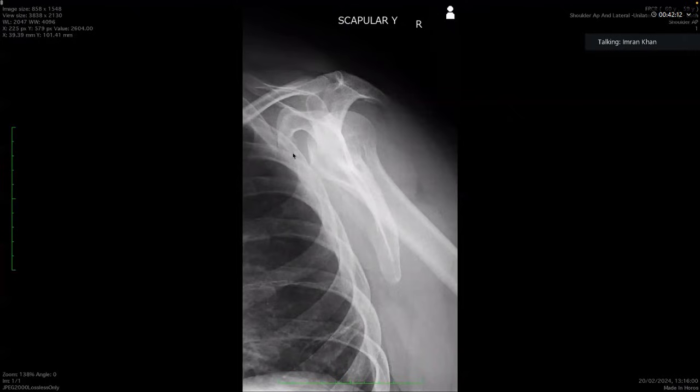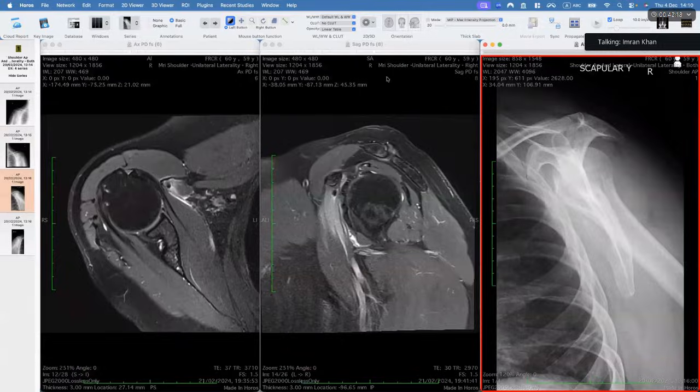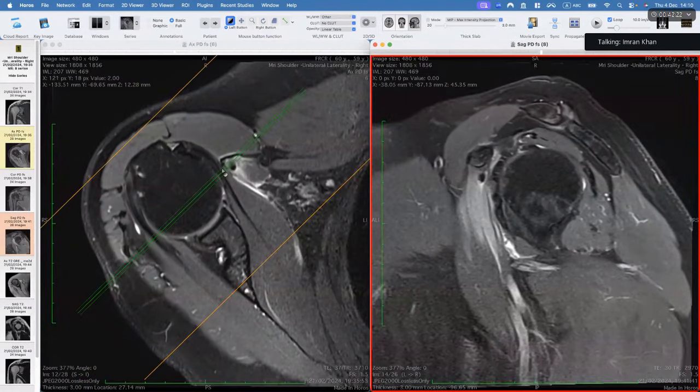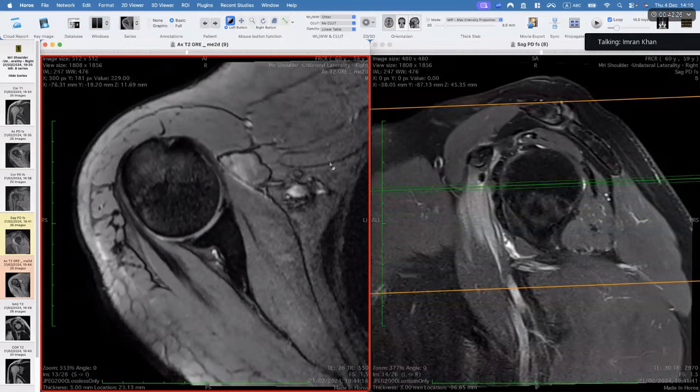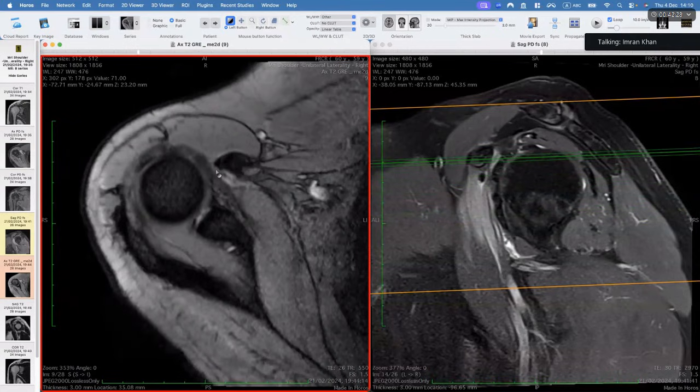The question I would ask if I was an examiner: I can't see the calcification, so how do I confirm it is a calcification? Well, you can look at gradient echo images, which do show calcification. Or you can do an axillary view of the shoulder, and sometimes you may be able to pick up the calcification near the coracoid process.